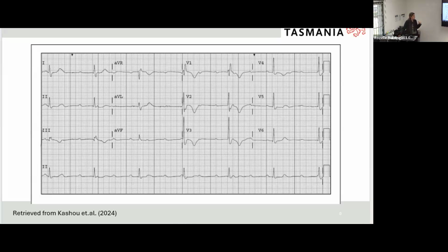We looked at the rhythm before, and we know that there's a dissociation. We know there's an AV block. So now we're suspicious that our pattern for our QRS complex, our depolarization, is not happening normally, maybe because of a bundle branch block, because of the AV block. So now we need to see, is there going to be a block in both our right and left bundle branches as well? That's what we're going to start to look at now.